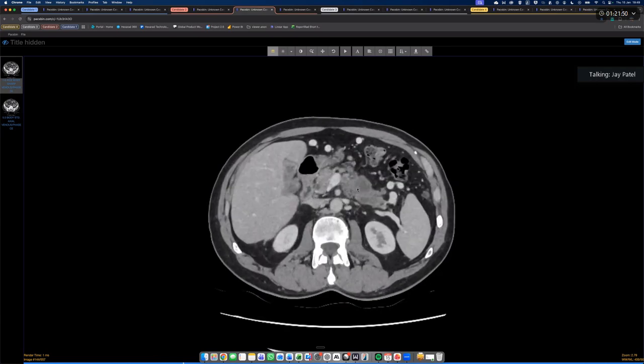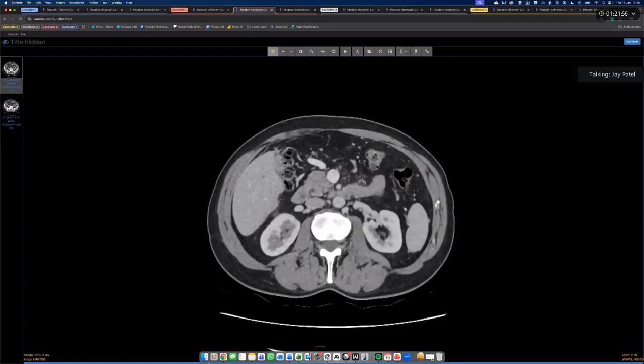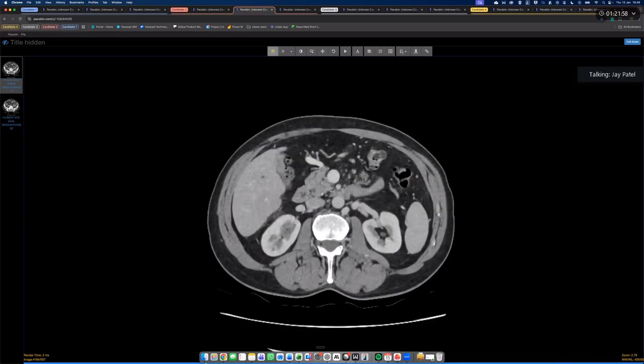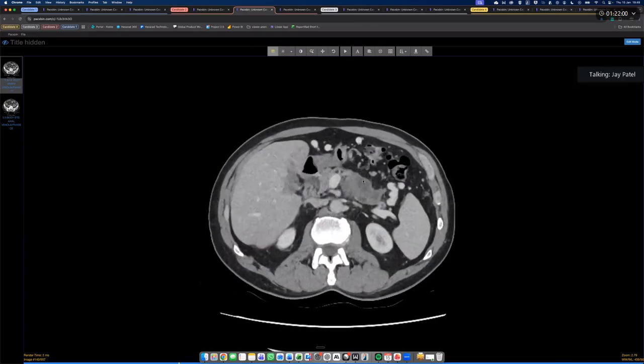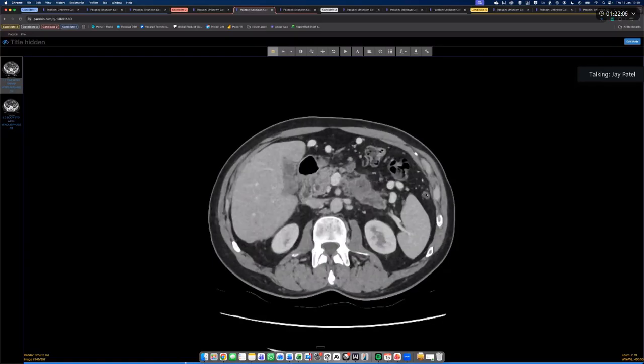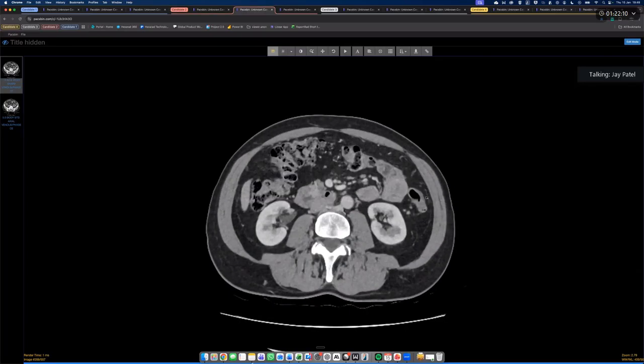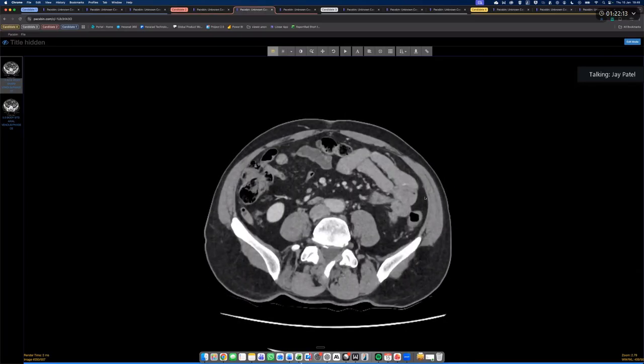So you identify the pancreatic tumor and you identified that there's some areas below it that appear discrete and separate from the primary tumor, concerning for local invasion or peritoneal disease. Actually, if you look, there's really quite widespread peritoneal disease. There's disease over here. The more you go down, the more you see. If you go down into the pelvis, there's quite a lot.